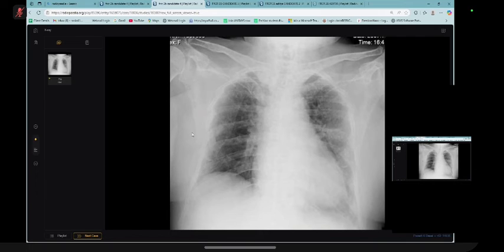Sir, X-ray chest frontal projection of an adult, in which in bilateral lung fields I can see multiple small reticular nodular shadowing, more of a nodular nature. Apart from that, the right CP angle is okay, but on the left there appear to be hyperdense lesions within the left lower lung.